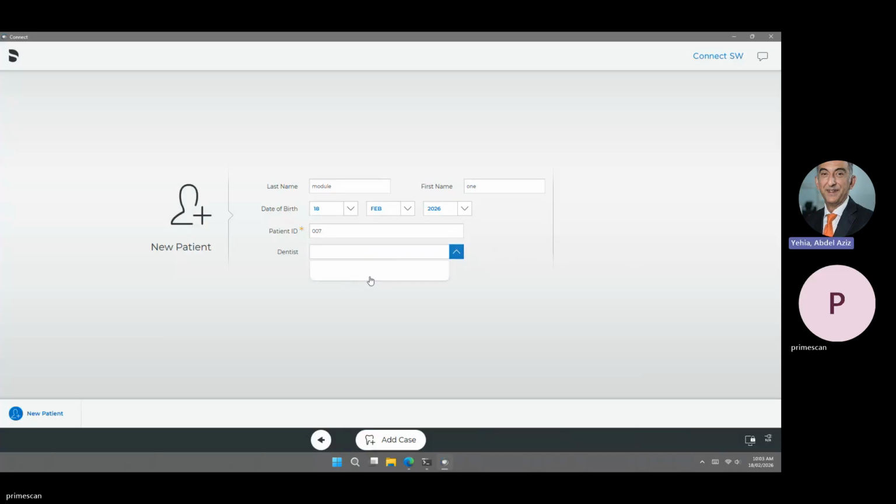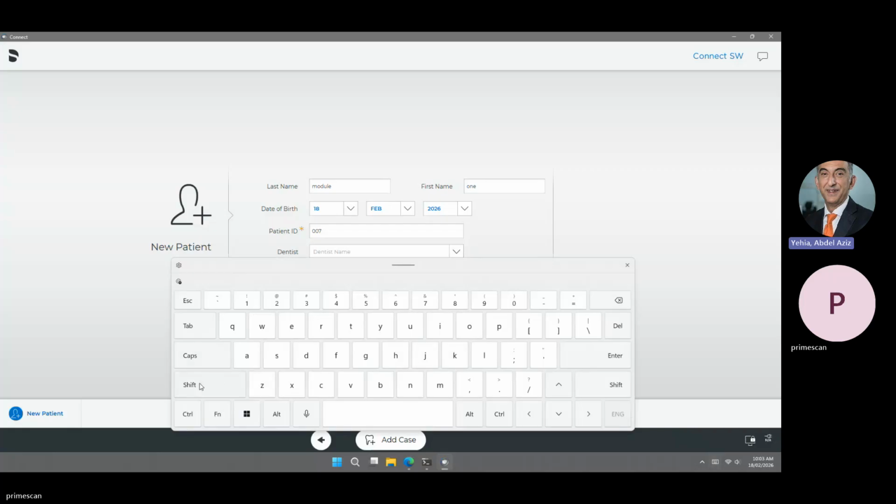So I don't want to write Abdulaziz once and then Dr. Abdulaziz a second time and then Dr. Abdulaziz a third time. If I have it written in one way, even a nickname, then I will find it next time. So I will go ahead and just put my nickname.